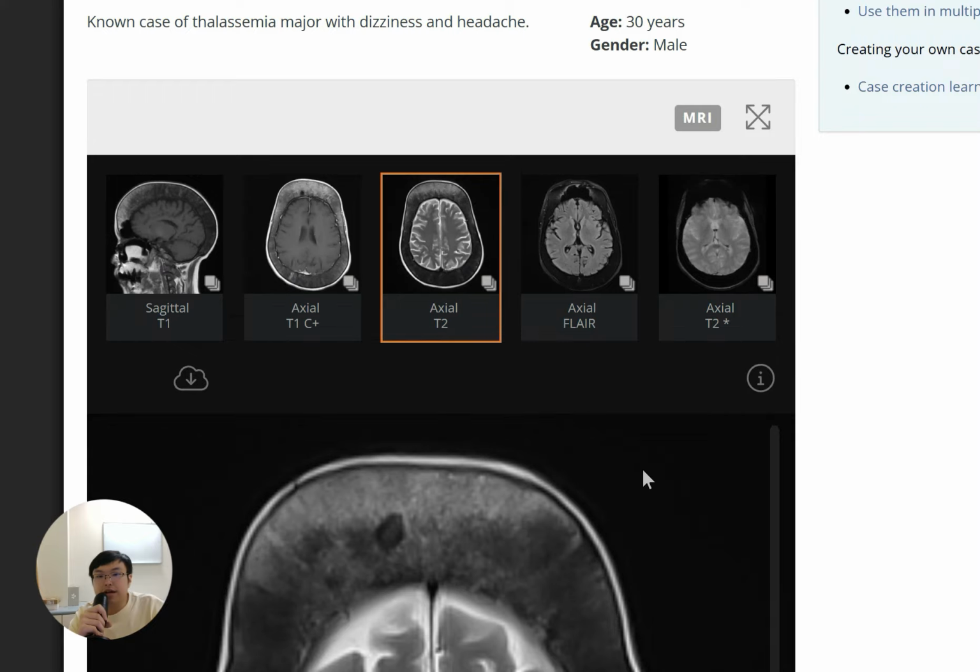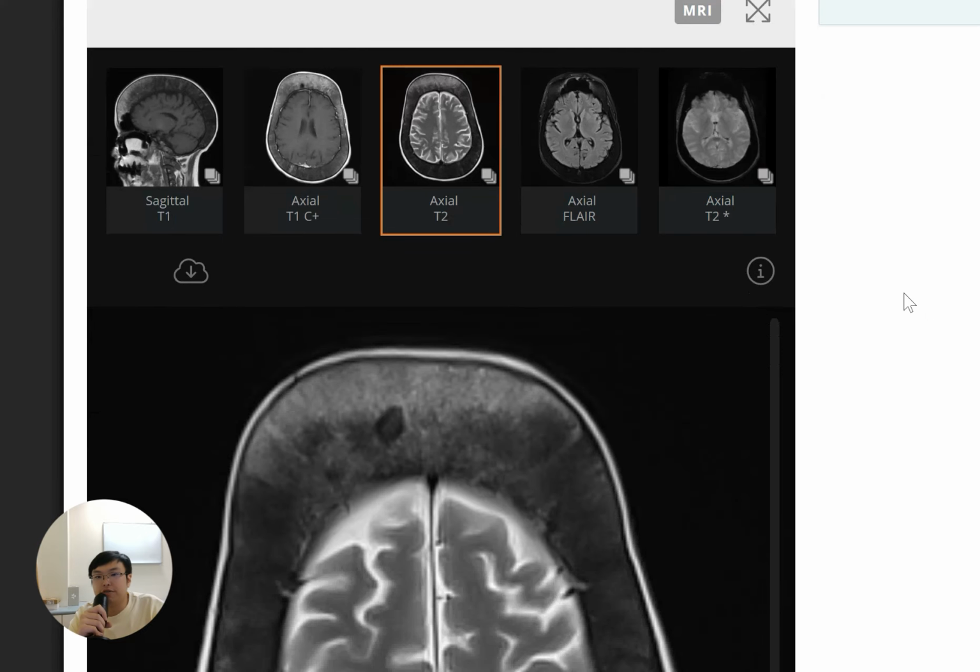Which is a very important thing to comment on in this kind of patient. So at least we know that this patient is not having optimal treatment and should at least adjust the regimen. Whenever already having any treatment, it is still suboptimal.